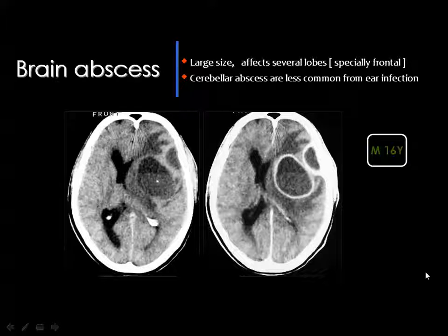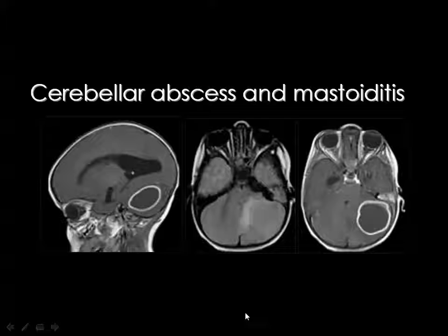Brain abscesses may be unilocular, multilocular, or multiple with a major one and satellite lesions. Usually they show marginal enhancement of uniform thickness, and they are surrounded by variable degrees of brain edema with variable mass effect.